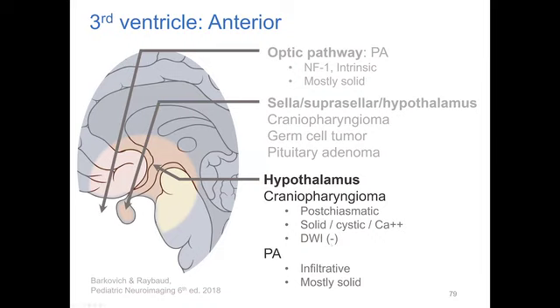The craniopharyngiomas tend to be more complex, solid and cystic, and tend to have more calcifications. Pilocytic astrocytomas usually have no calcifications, and the pilocytic should be more centered in the hypothalamus, and the craniopharyngioma should be centered more in the ventricles or suprasellar regions. So probably those are the clues to differentiate these two.